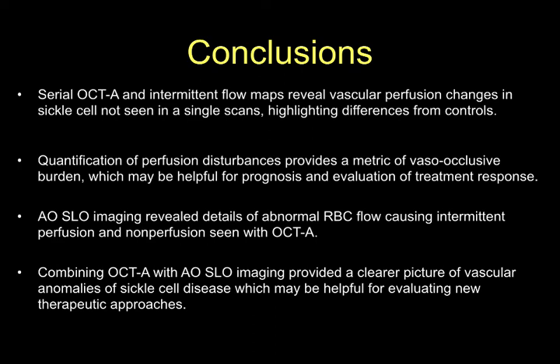Adaptive optics SLO imaging revealed details of abnormal red blood cell flow causing the intermittent perfusion and non-perfusion seen in the OCTA. Combining OCTA and adaptive optics imaging provides a clearer picture of the vascular anomalies of sickle cell disease, which may be helpful for evaluating new therapeutic approaches.